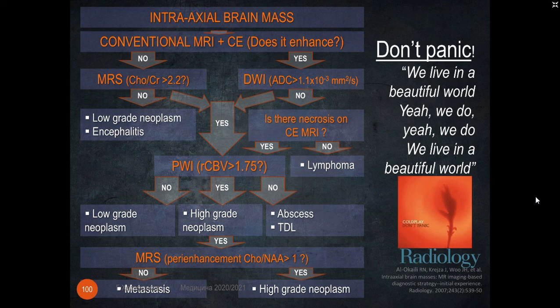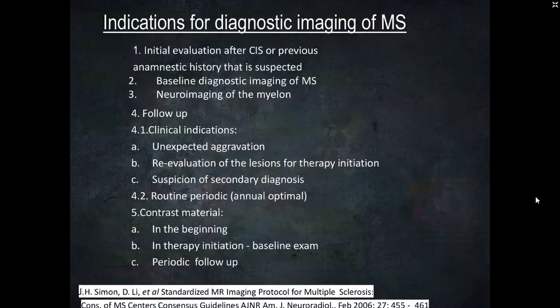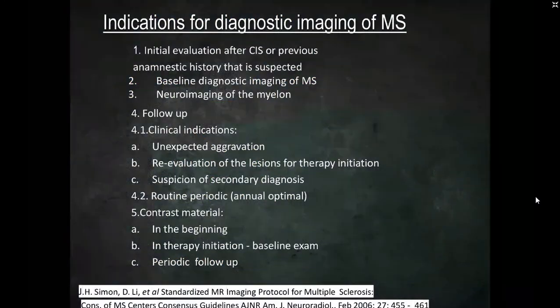And don't panic with all those tumors. Really, it's difficult sometimes to rule out. But if we are able only to make a descriptive assessment in our report and to give one or two differentials, sometimes it's enough for you especially.